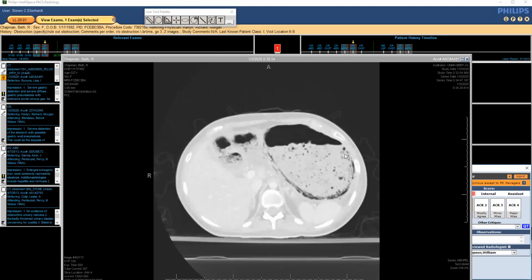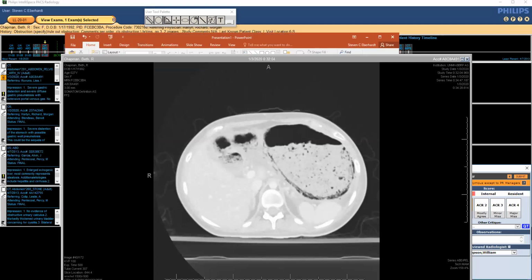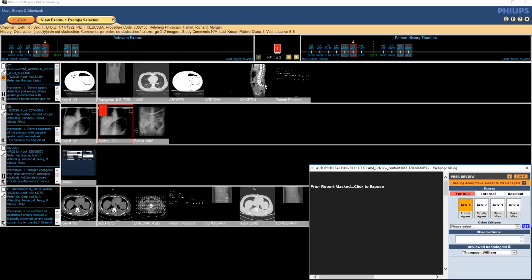So they did endoscopies. I don't know why I can't scroll on this one now. It's being ornery again. They found that the stomach was full of ingested contents, and that the wall of the bowel did show signs of ischemia. Let me see if I can get that, the material that was in the stomach, and then these patches.